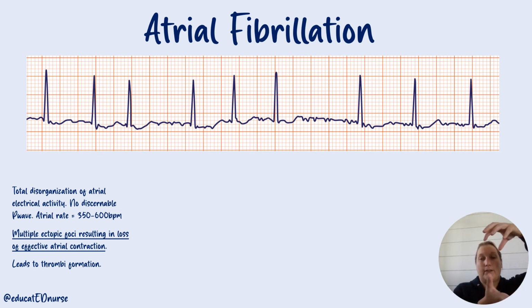So every time the ventricle squeezes once, the atria is going to be squeezing 6 times and then a ventricle squeeze. All right, so something like that. That's bad, right? And what causes atrial fibrillation in these multiple fibrillatory waves?